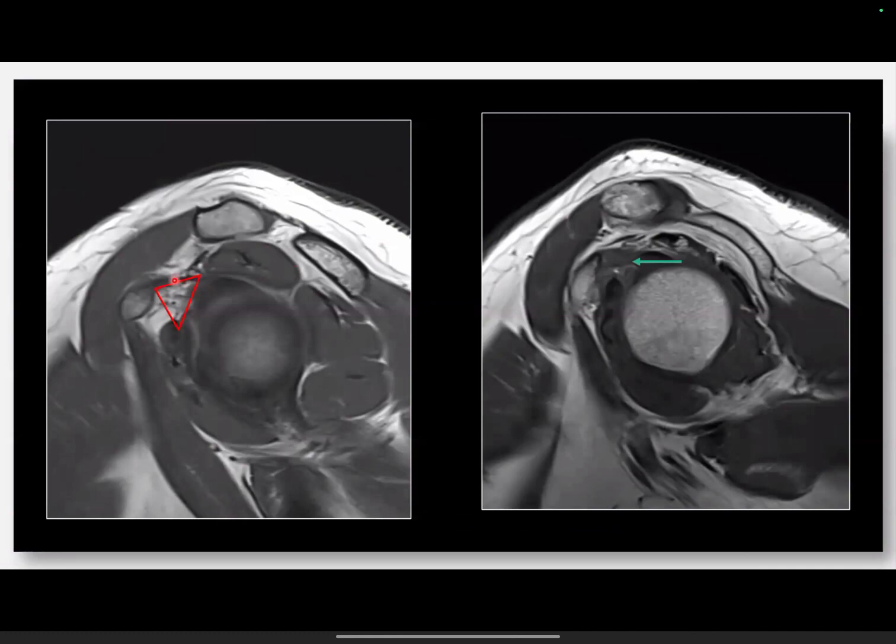As we have discussed, this is the anterior rotator interval, the space between the subscapularis and supraspinatus tendons. The basic component of the rotator interval is fat. So whenever you see fat and a normal coracohumeral ligament, the rotator interval is normal on MR. But compared to these two images, here there is no fat in the rotator interval; there is complete effacement of the fat pad. There is significant fibrosis in the anterior rotator interval and significant thickening of the coracohumeral ligament. So this is a confirmed case of adhesive capsulitis.